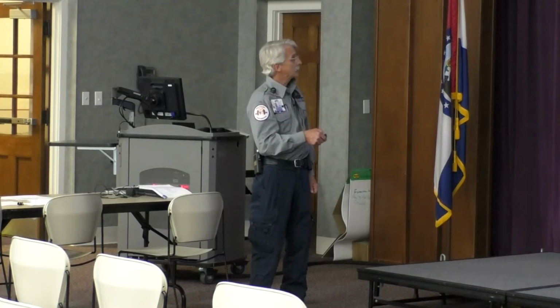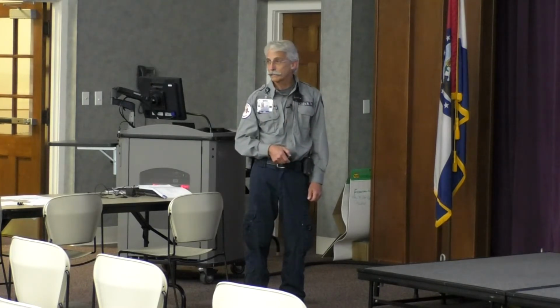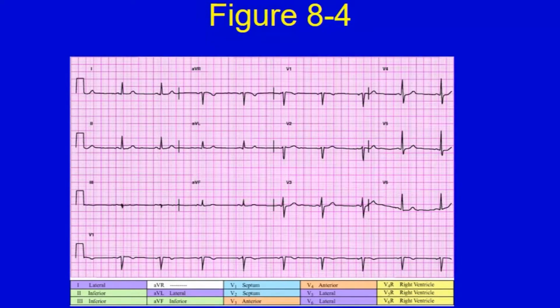So this beat is the same beat as this one, that's the same beat as this one. You're just looking at it from a different point of view. These are all the same beat that are the same as this one. And this one is the same. So can you imagine if we put a PVC out here someplace that I wouldn't know, God, what the heck is that out there in the middle of this thing? Well, that's the reason that we have this 4-channel thing. Because I got one running across the bottom that tells me what a single rhythm is all the way across.